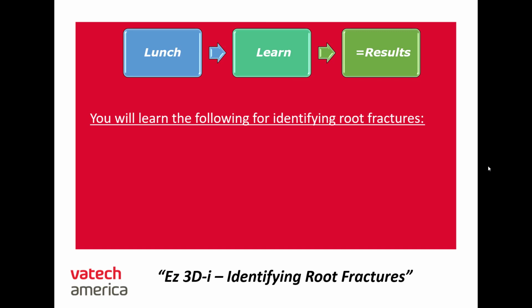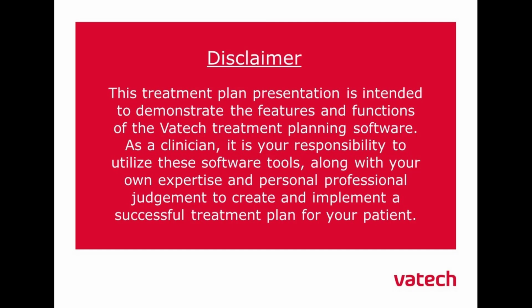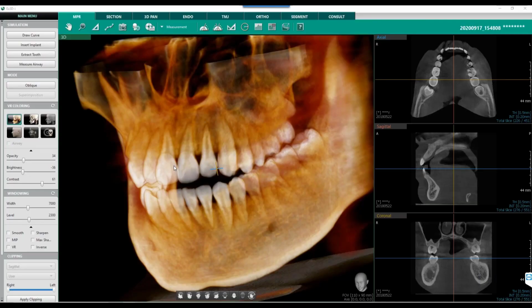So today you will learn the following for identifying root fractures: optimal planes of view, utilizing filters, and consistent software workflow. So today we're going to look at identifying root fractures within the Vatech 3DI software, specifically looking at methods, workflows, and tools that will help visualize.